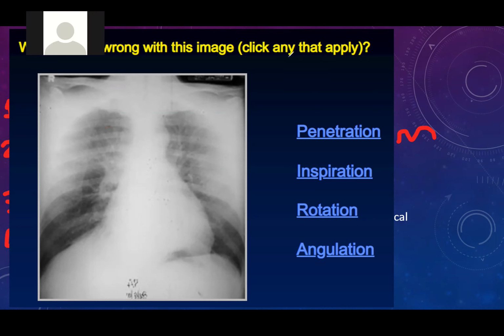Okay, doctor. For rotation, I cannot see the clavicles well, but it looks like it's good. Okay, rotation. I'm seeing some experience here. Good one. Yeah, I cannot see them as well, but it's symmetrical, right? I can see it's pretty symmetrical. Good. So the rotation is good. When we look at the angulation, the clavicles are above the apex, so it's bad angulation also. Definitely. So 3 of the 4 factors are not enough. Only the rotation is good. Thank you, doctor. That was a very good evaluation.